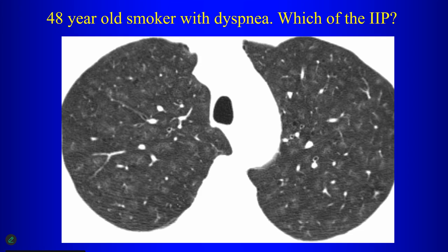If you look carefully, and sometimes you'll notice this on CT scans of heavy smokers, lung cancer screening, you might notice these areas. It's rather subtle, but there are these areas of central lobular ground glass opacity. So respiratory bronchiolitis is a common finding both on imaging and also in pathology in smokers. They don't have to be symptomatic.